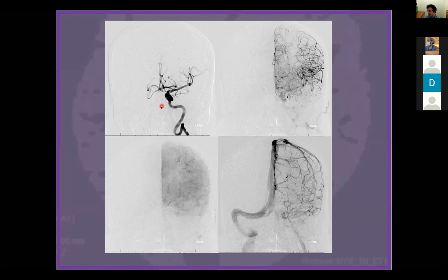And so here, again, you inject the left carotid and still don't see the sinus. So three possibilities arise when you've injected everything and you don't see it. One is it never formed. Two is it's closed, thrombosed, or filled with something. And three, something else is using it, and that usually is a dural fistula.